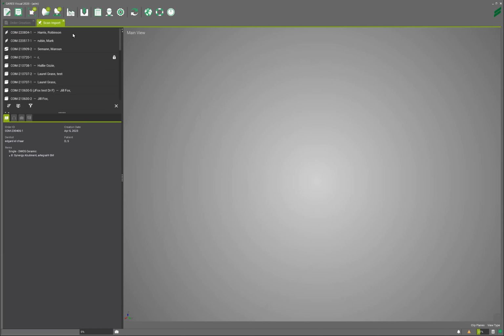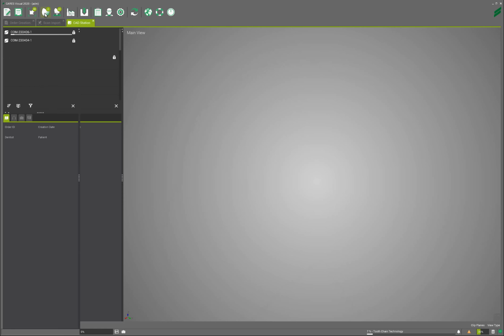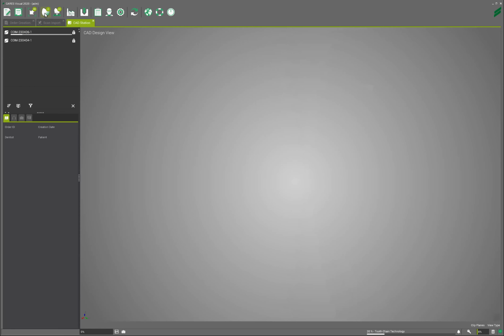And now I am going to go to the CAD station. And now it's going to pick up the case. And again, I verify here. I drop it here.